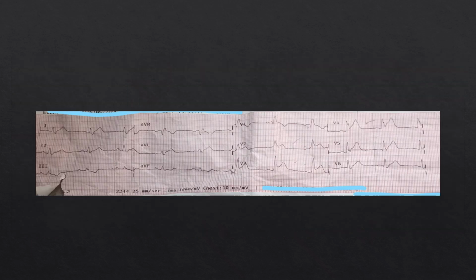And a similar case here, patient's bradycardic, but otherwise pretty much the same presentation. We have a right bundle RSR prime pattern in V1, upright QRS complexes throughout the entire precordial leads, and you have ST elevation following the QRS in those leads. So this is another anteroseptal STEMI overlaid on a right bundle.